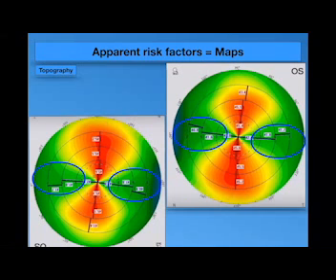So the difference is accepted in the inferior up to 1.5, in the superior up to 2.5. And don't forget all the time that the clinical correlation is so important. Don't forget that you are an ophthalmologist. There's a vertical and there is a horizontal meridian. The difference between both will express the corneal astigmatism, the anterior corneal astigmatism.